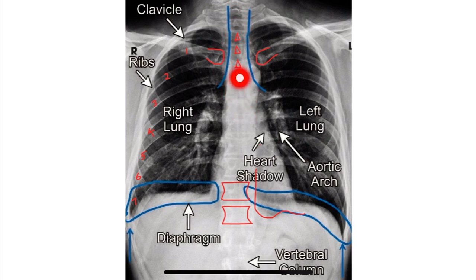First we will check the position of the trachea and bronchi. If it is deviated to the right side, it suggests right-sided fibrosis or right-sided lung collapse. Or in the left side, there may be left-sided pleural effusion, left-sided pneumothorax, hydropneumothorax or tension pneumothorax.